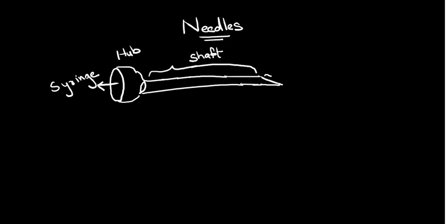Bevel of the needle, that is where it is cut into a very sharp area so that it can pierce into the skin and can be inserted into the veins, arteries, or even go into intramuscular or subcutaneous tissue, etc. So this is the bevel.